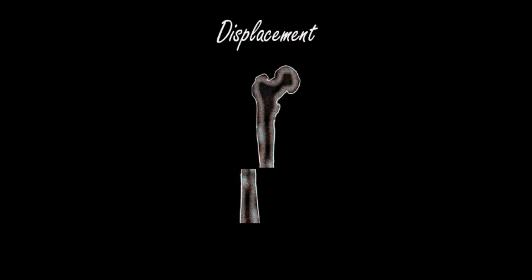So once you've described the type of fracture it is, you want to mention whether the fracture is displaced. Now the displacement is always in relation to the distal fragment. So in this case, it would be this fragment that you'd be talking about. So let's just take this example. Here's an example of a transverse fracture, but also the distal fragment has displaced.